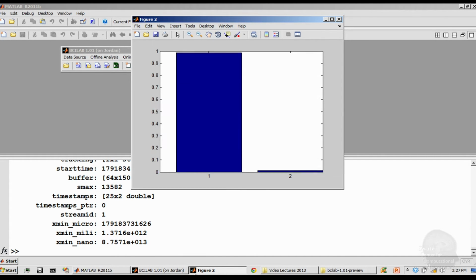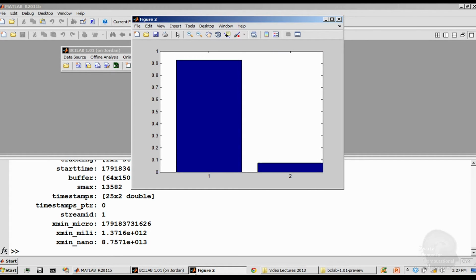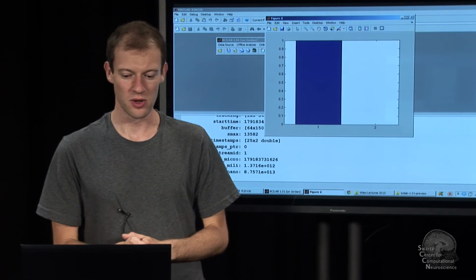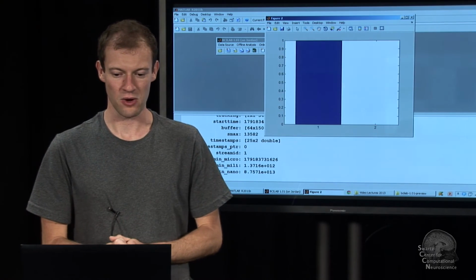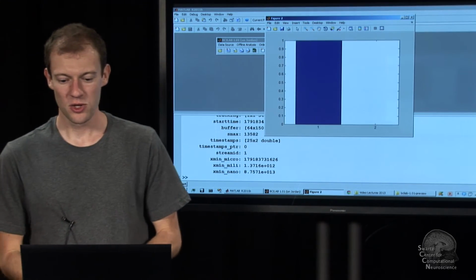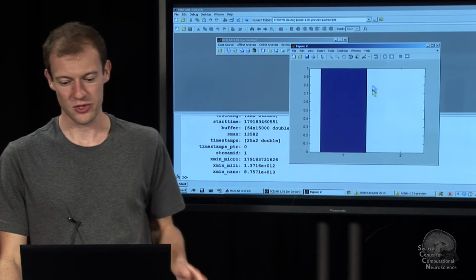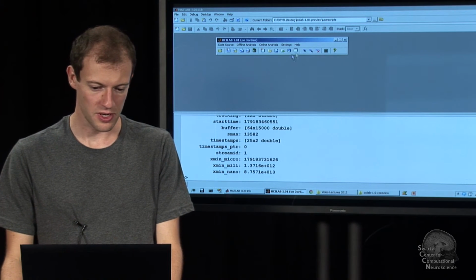But what's important is this particular model, most likely, has only ever seen data that is exactly at this particular latency relative to this kind of event. So if you always query the BCI relative to this event, you will approximate, in real time, this accuracy of, say, error rate of 10%. But if you slide it over data where all sorts of things are happening, such as a person is resting or a person is sneezing or so, you might get erratic behavior. And so it's important that you train the data on the kind of stuff that you want to later on test it on. Anyway, so I close this.